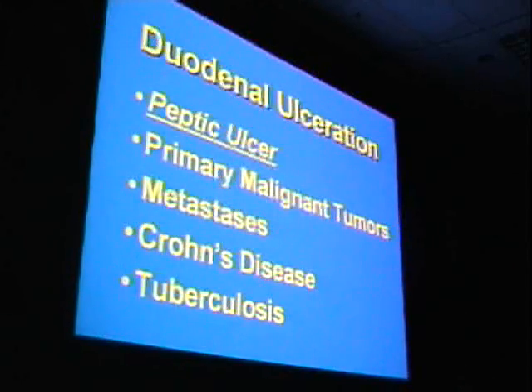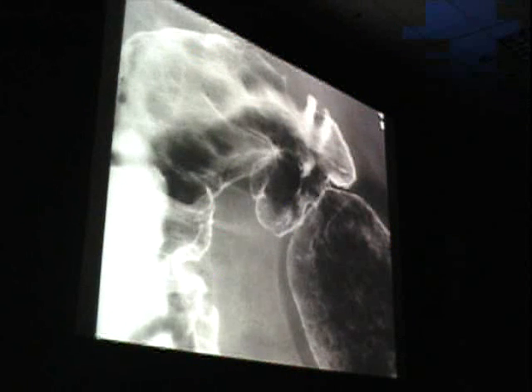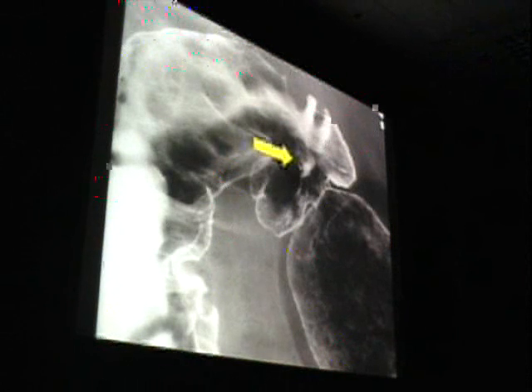We used to see tons of peptic ulcers in the duodenal bulb. It turns out that we don't see one a year, and that's because, again, I think this is a disease that's gone by the wayside because it's basically being treated. There's really no reason to scope somebody if we see an ulcer because almost 99.9% are benign. Obviously, a variety of other things can produce ulceration. Classic appearance: ulcer in the central portion of the bulb, radiating folds. This has a 100% chance of being benign.